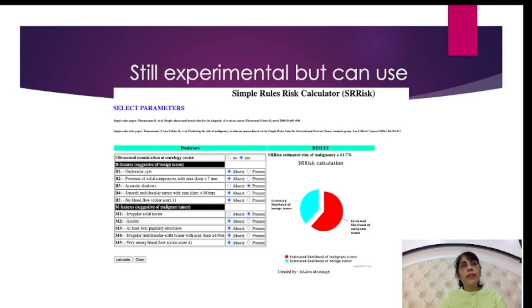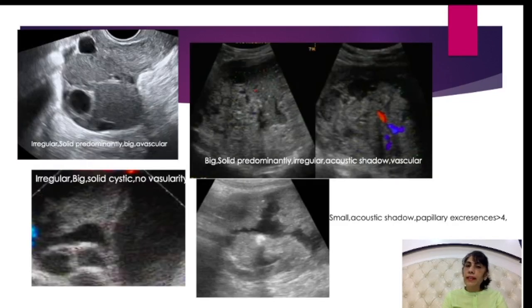So you have to be cautious and always put color in ovarian masses. It will give you a very good clue. Mostly the benign masses will not show you color. Dermoids are also avascular. The hemorrhagic cysts, endometriotic cysts, follicular cysts all just show you flow at the periphery. So be very cautious when you are diagnosing, and this can help you in cases where you are confused.